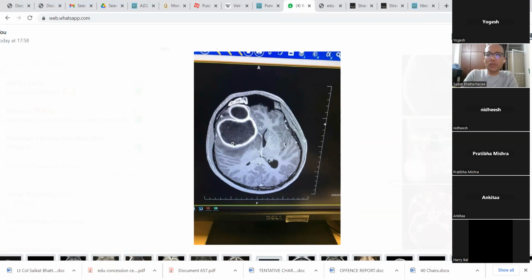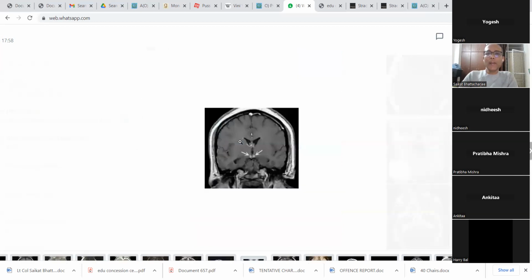That is one of the commonest causes of how a cerebral abscess develops: spread of infection from the paranasal sinuses into the extradural, dural, subdural, intraparenchymal, intraventricular spaces. I'm going from outside to inside and further in. So this is a cerebral abscess secondary to right frontal sinusitis. Good.